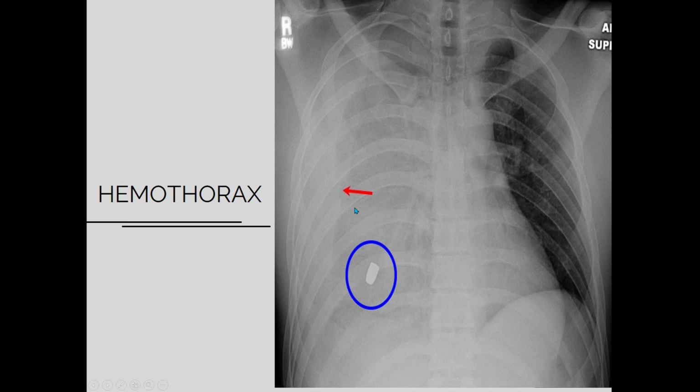And you can notice the lung margin here. If you notice very carefully, you can see the lung margin, that is the collapsed lung. And why is this collapsed? Because of the hemorrhage. So this is basically hemothorax, and this is again AP supine. Why can we say AP supine, although in this we cannot see the clavicles straighter, these are more slanted? Even then we can diagnose it as AP supine, because we cannot see the gastric bubble and we cannot see the air fluid level in this hemithorax.